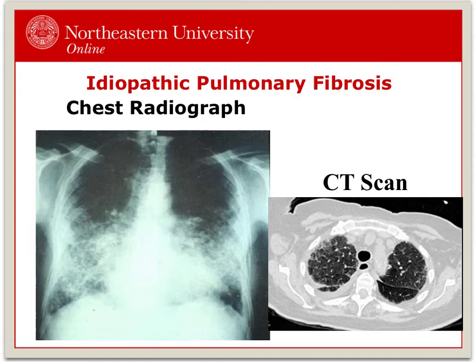Image 2 is a CT scan of the right anterior lung. We note a honeycomb appearance. This is a hallmark sign of IPF. As PTs visualizing these images, we can observe the severity of the disease and the specificity. If there is a more localized area affected, physical therapists can position the patients for maximal ventilation perfusion matching. In this case, it would be laying the patient on their left side to assist in improved oxygenation.